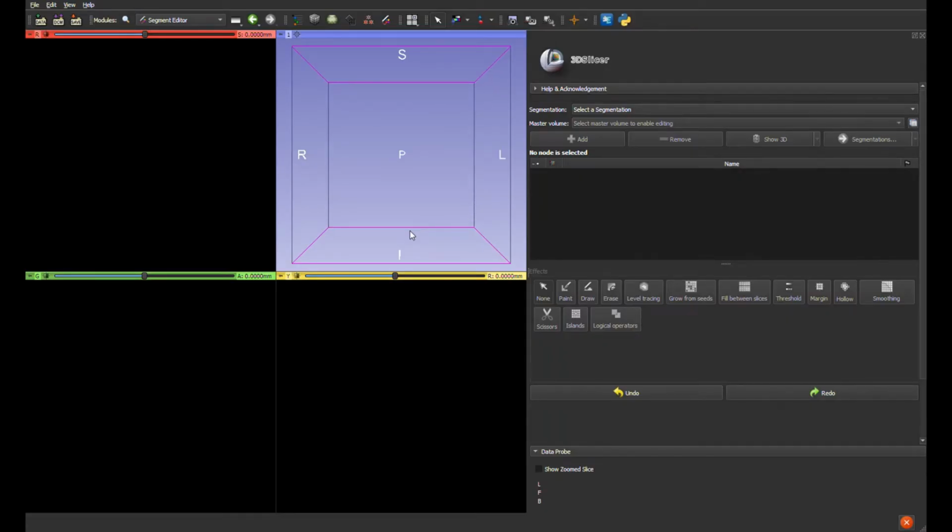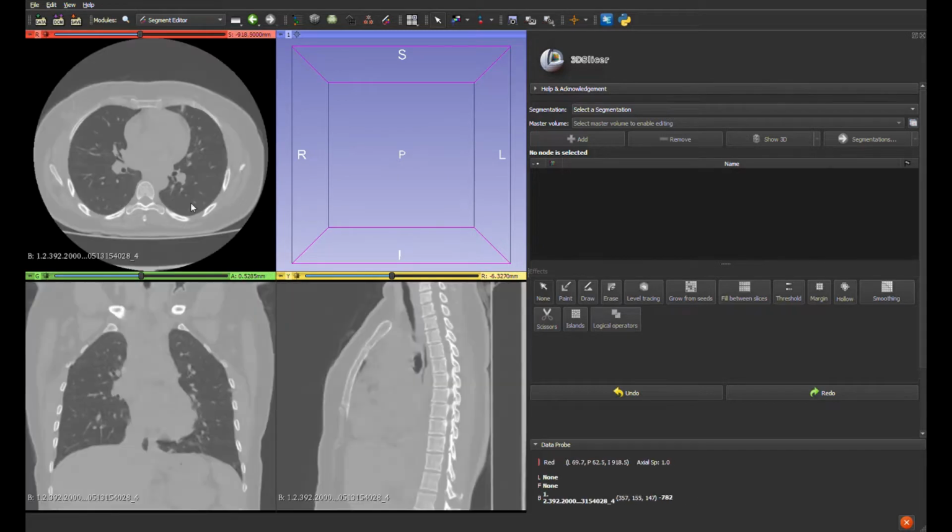This is a reference annotation sample for annotating COVID CT lesions on a CT lung. So first we load the data. You do that by clicking on data and choose files to add. From here we select which file to add and then click on open. The description needs to be volume and you click on OK and it will load the particular file into the memory. So now we need to first change the window settings.